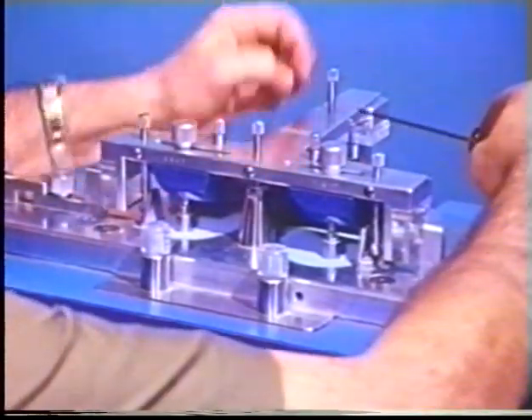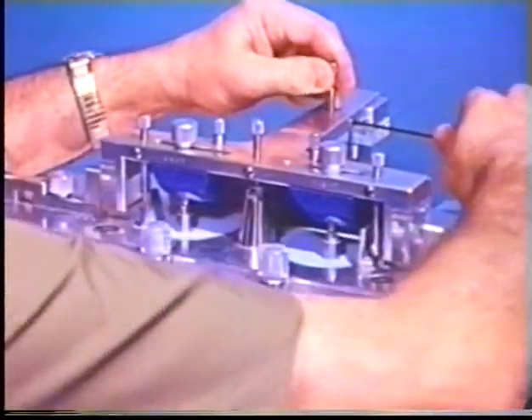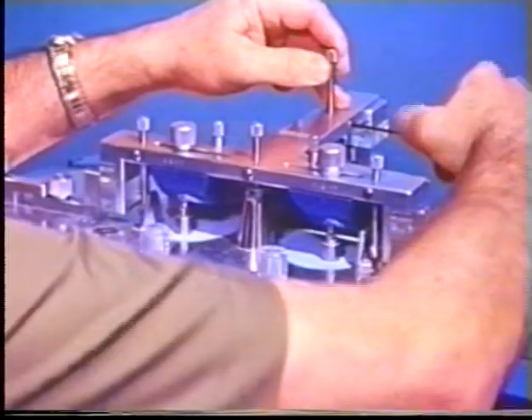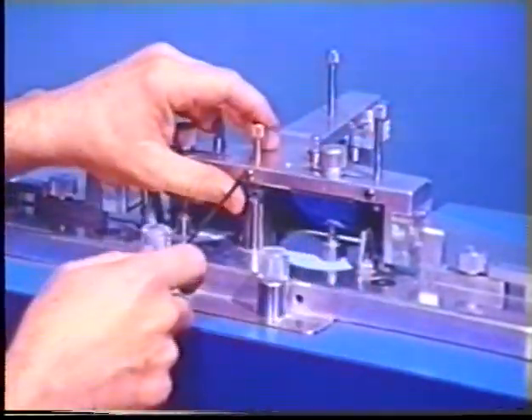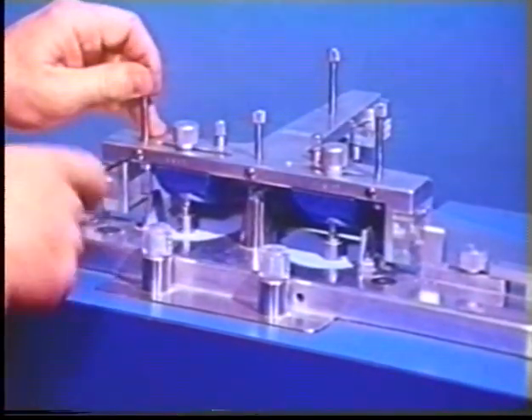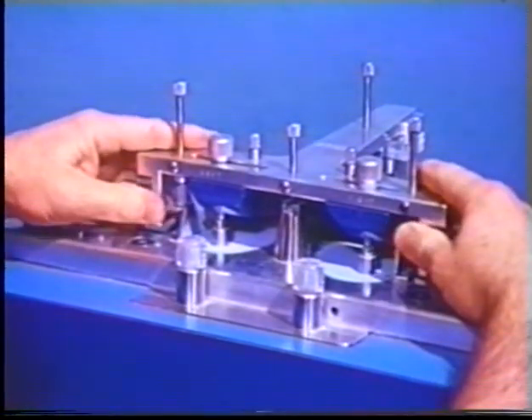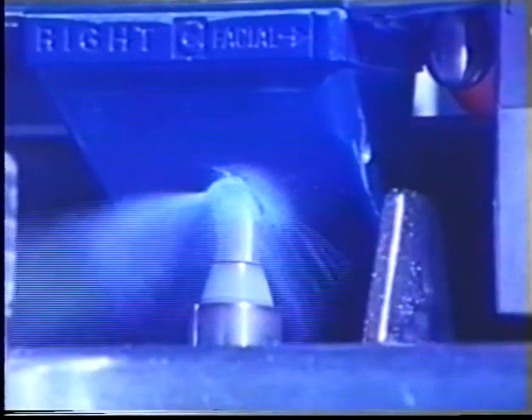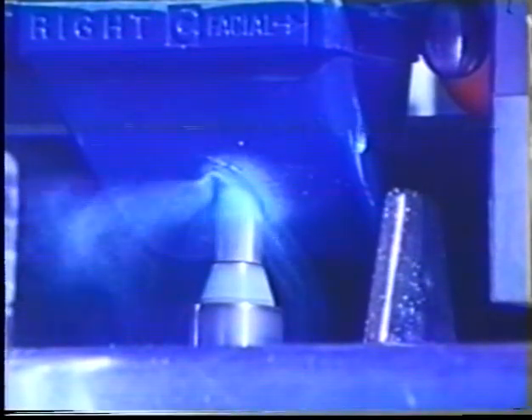The 4 vertical posts, which ensure the precise centric openings in the blocks, are raised and locked out of position so that the patient's recordings can guide the movements of the T-frame for generating the analogs. The 1/4-inch vertical mills are activated with a foot control, and the frame is moved distally while being guided by the protrusive recordings.